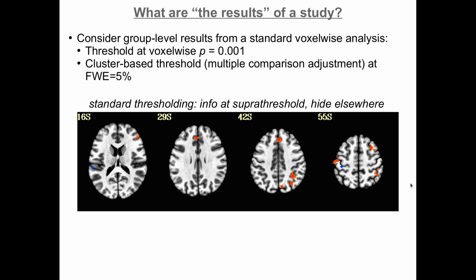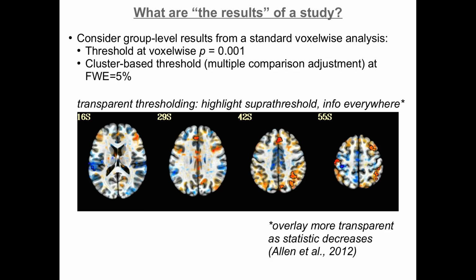Okay, and this is, I think, what we've been used to seeing for brain imaging published in newspapers, papers, conferences, etc. But it does raise the question of, well, why is this here and very lateralized, and what happened over here on the other side? And anyways, what do we know about it? We know nothing here.